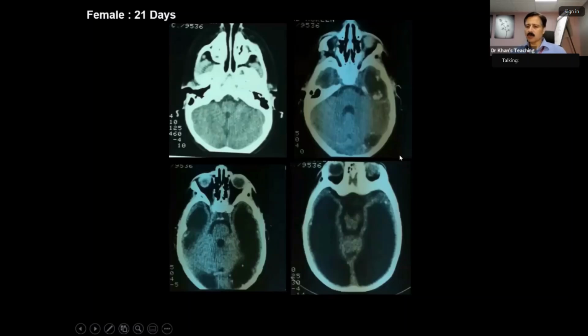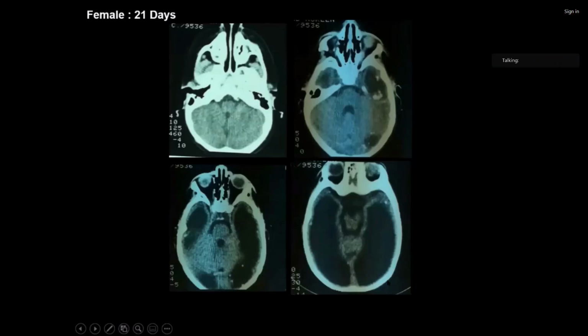Okay, over to you. What is happening here? So there is a massively dilated supratentorial ventricular system with periventricular calcification, I think, as well as calcifications in the right eye, maybe bilateral ocular calcification. I think this is a congenital CMV infection.